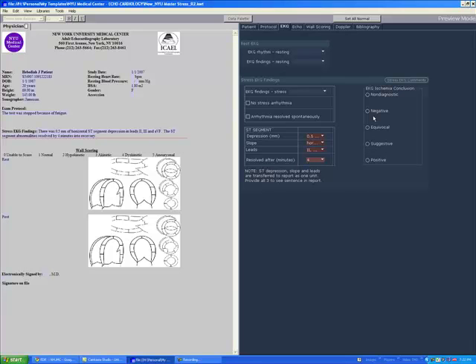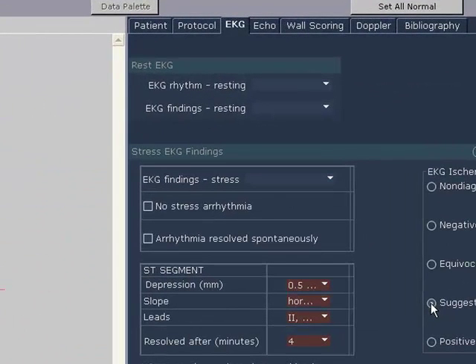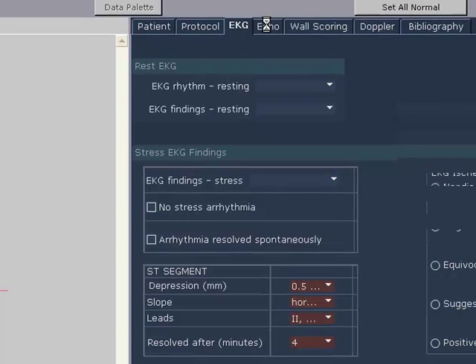And the final portion of the EKG tab is the conclusion. Now I have changed that to be an exclusive choice, meaning you can choose only one. In a prior version, it was a checkoff list, and by mistake you could choose positive and negative simultaneously. Here it's only one choice. If it's negative, it's negative. If it's positive, it's going to be positive. These are radio buttons, so-called. If you choose one, the other is automatically clicked off. If you like none of the options, you just click on the option that you selected, and now none of them is selected.